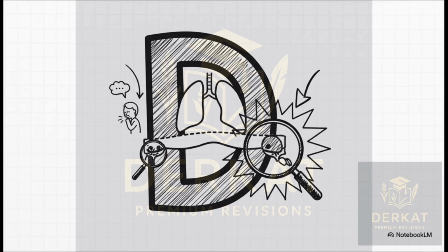All right, on to D for diaphragm. The right side is normally a little bit higher than the left because the liver sits right underneath it. What you want to do is check the shape. Are the domes nice and curved, or are they flattened out? Because flattening is a classic sign of COPD. And critically, you need to look for a tiny sliver of black air under the diaphragm. That is free gas, and it means there's a perforation in the bowel, which is a surgical emergency.